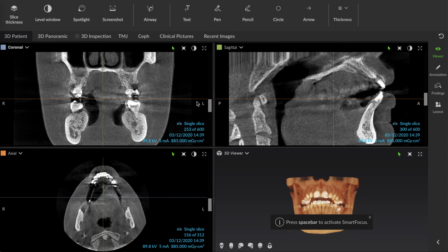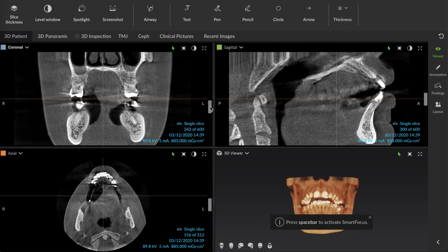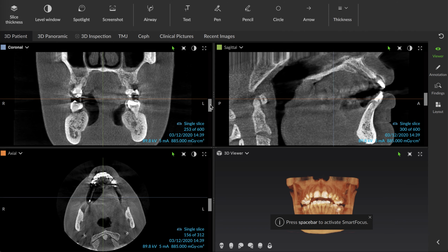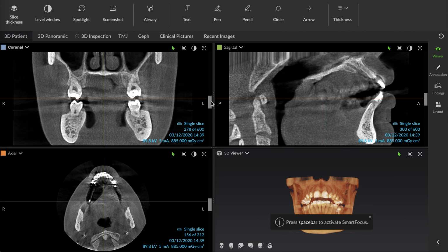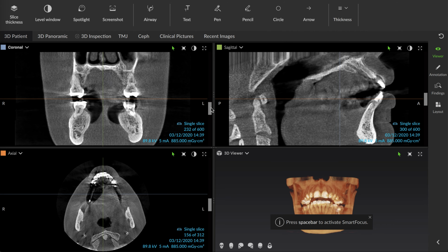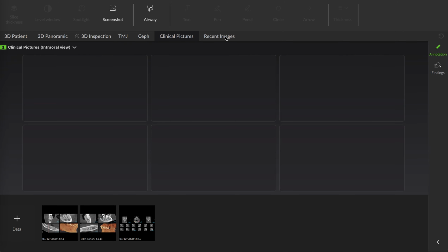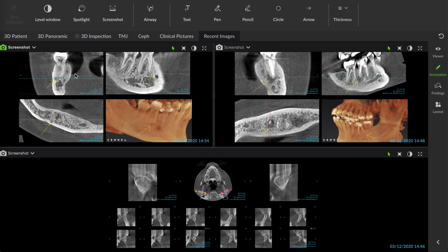This is from yesterday. I had a patient present on a referral from her family care physician. She'd been having repeated earaches and general pain, which she thought was TMJ. So we spent some time doing a little evaluation and diagnosis and took a 3D x-ray, and we came up with a diagnosis that she has a periapical abscess on the lower right and a significant recurrent periapical abscess on the lower left around a previously treated root canal.